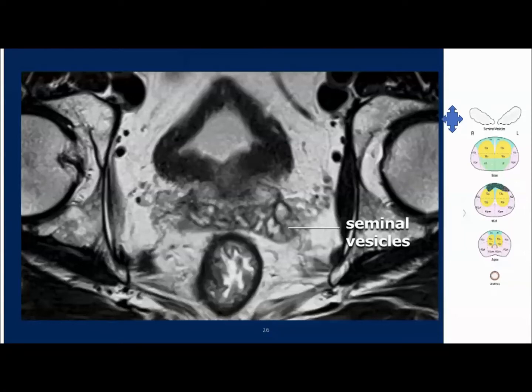It's important to know what the T2 weighted and ADC map corresponding images are showing to make a diagnosis of what PIRADS grade this is, and how it is diagnosed. So it's the most important component of today's talk, and Dr. Basit Salam is going to take you through the PIRADS grading system and how PIRADS grading is done. We'll give you examples subsequently as well. So Dr. Basit, over to you.